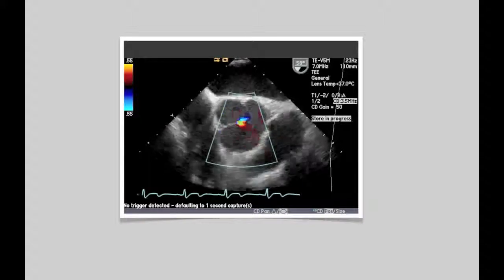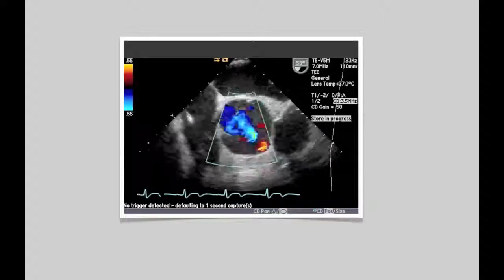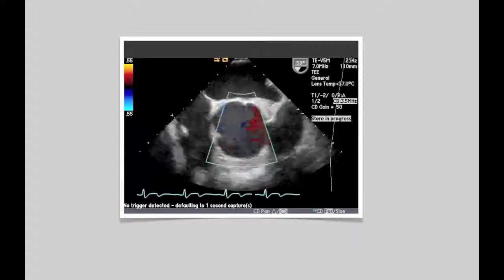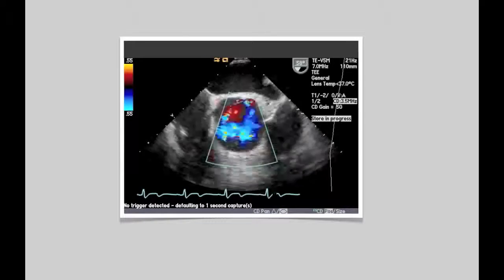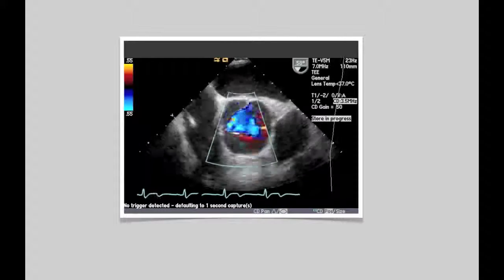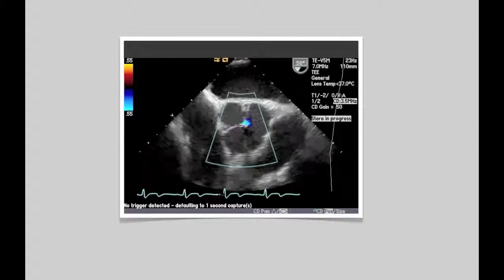So that is something we observe before we even assess the severity of aortic regurgitation, since if that Nyquist limit is low, you may artificially be seeing aliasing that suggests more severe aortic insufficiency. In this case, that's a totally normal Nyquist limit, and we see in the short axis that there is a small amount of color flow leaking back through the valve in diastole, suggesting trace aortic insufficiency.